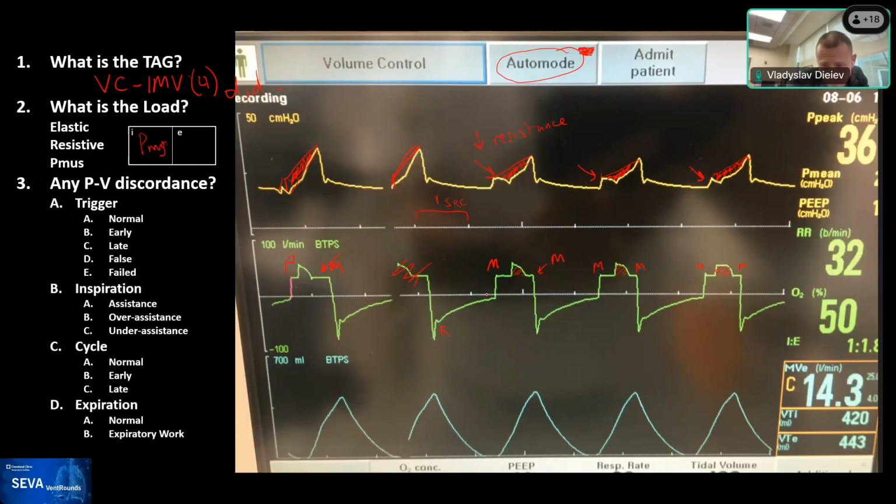So even though the return to the baseline looks a little prolonged, in the context of the expiratory time it takes, we see the seconds marked on the white baseline. So it actually takes less than 1.5 seconds to return the breath to the baseline. So probably not a very high resistive load. If anything, it would be elastic load or normal.